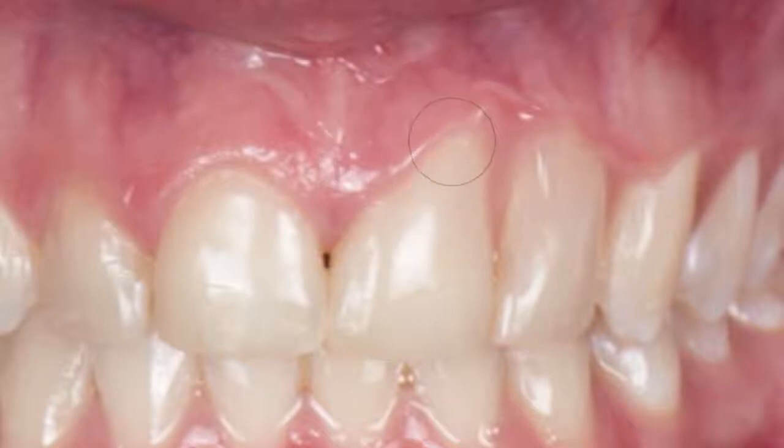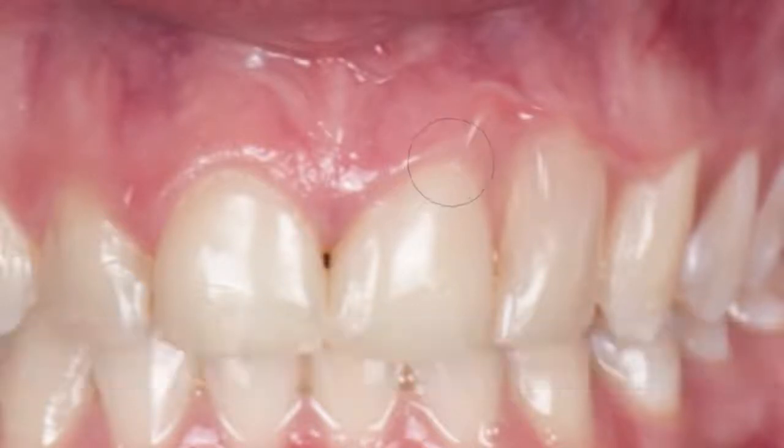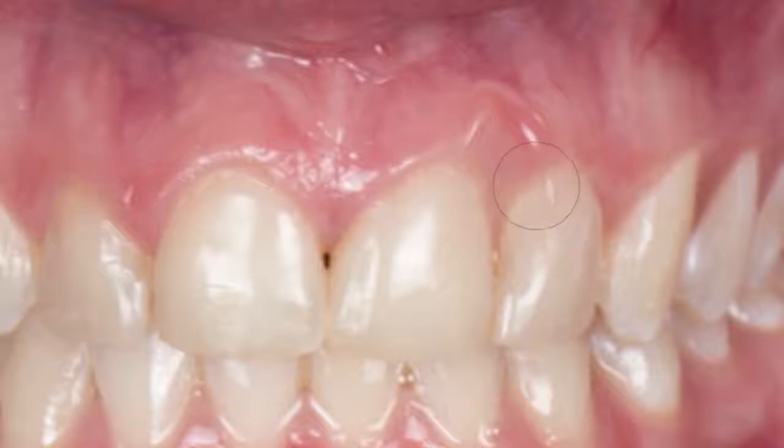So what we're going to do is bring our gingiva down. We're going to simulate some root coverage here. So I'm going to try and put back what I think should be there, and then we can measure this the same way we measured teeth before, and then let our surgeon know and or the patient know what may or may not be possible. Okay, that's about what we'd like our gingiva to look like. Something like that will be under our teeth, obviously.